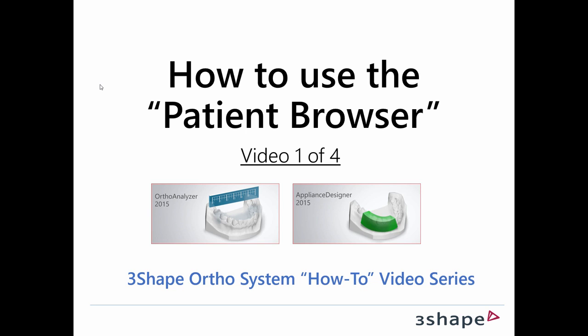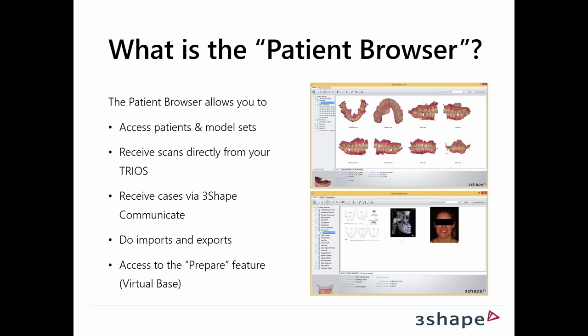Welcome to the first of 4 videos on how to use the patient browser in the 3Shape Ortho system. So what is the patient browser? Well, as the name probably reveals, it allows you to access your patients and the model sets or cases associated with those patients. You can receive scans directly from your Trios intraoral scanner. You can also receive cases via the 3Shape Communicate network.